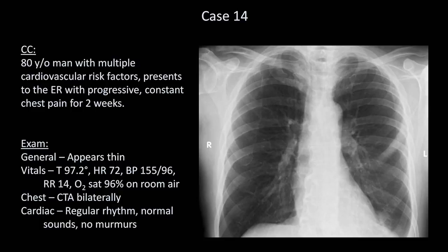Aside from that, this is also a great example of a chest X-ray finding that can be easily missed if the radiologist is not provided the clinical history, or if the ordering physician ignores the details of the clinical history when he or she interprets the film themselves.